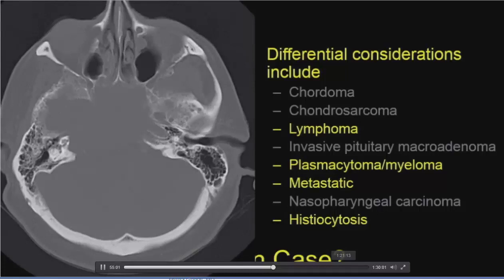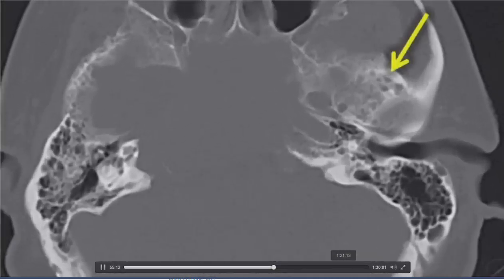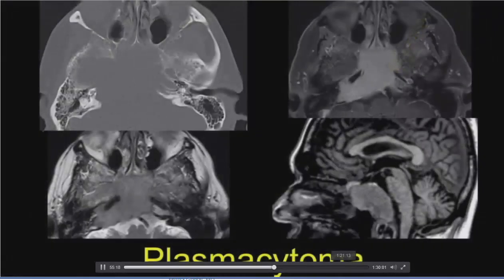And this is an area where we don't feel bad about recommending the other modality when we already have one, because they are complementary, and we know it's going to help them with their surgical approach and taking care of the patient. And when I zoomed this up and looked closely at this, I saw that there were all these other punched out lesions on the study. So because of that, I said, well, I think this is probably a patient with multiple myeloma and this is a plasmacytoma. And they showed me the case a week or so later and they said, oh, you were right about that.